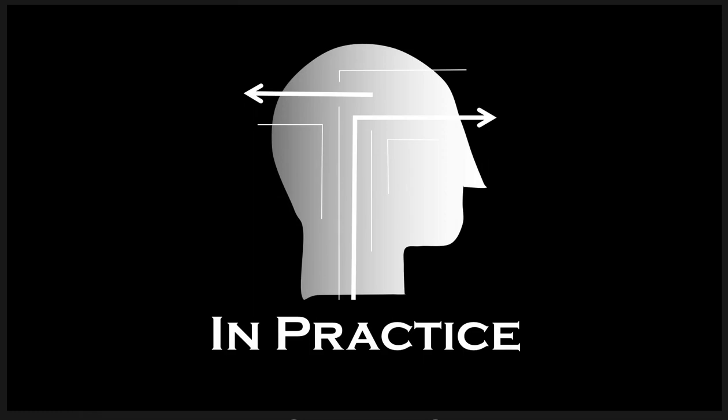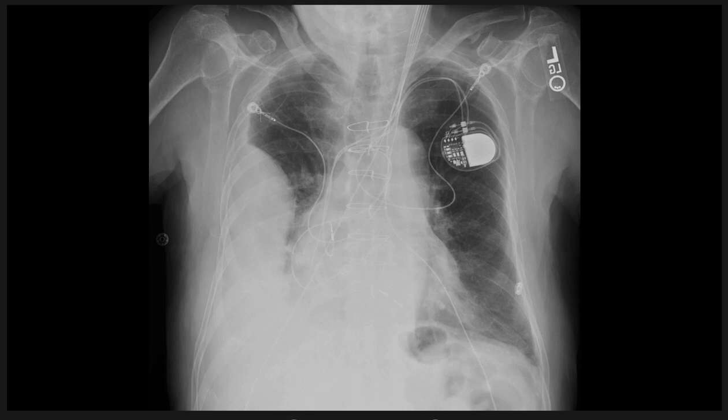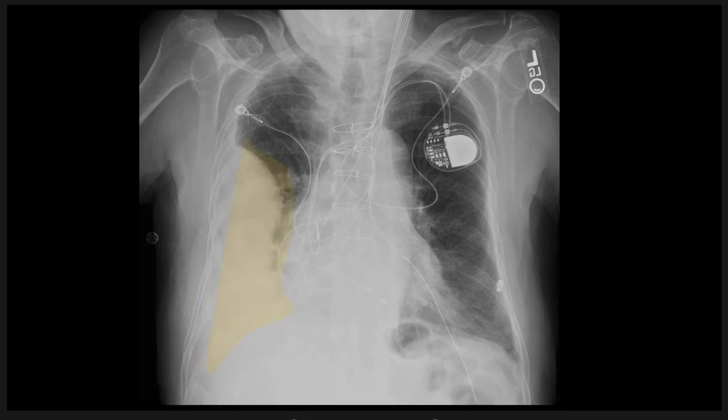All right, so let's take the time to compare a few more practical cases. So this is a good example of a loculated morphology, right? It's got that bulging appearance, looks like it's putting some mass effect on the lung. You can imagine that fluid being trapped in that position. And we'll prove it by placing the patient in this decubitus view.